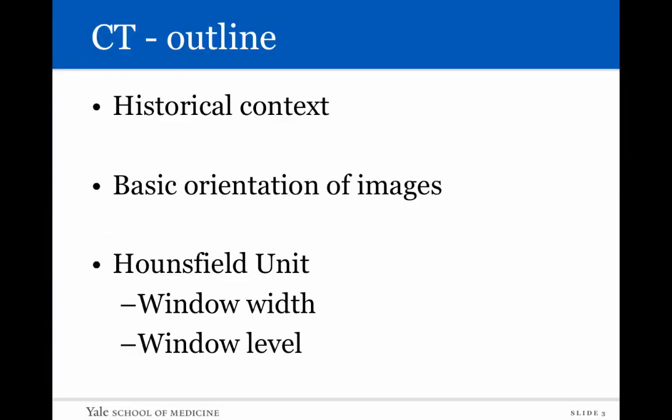And we'll go about doing this by looking briefly into the historical context of CT imaging. We'll talk about a basic orientation to CT images, and then we'll cover the Hounsfield unit and cover important concepts of window level and window width.